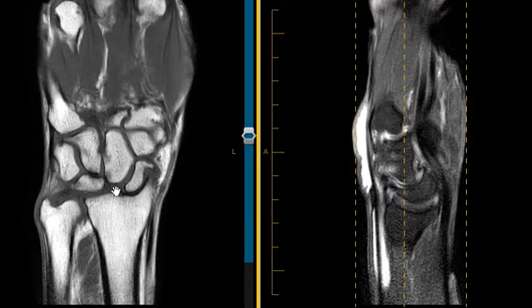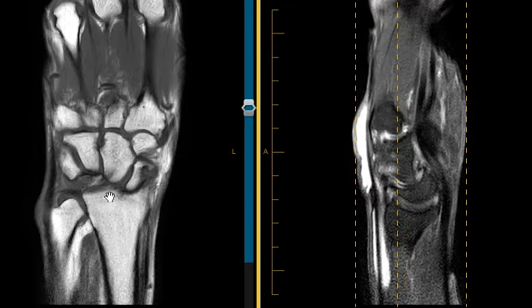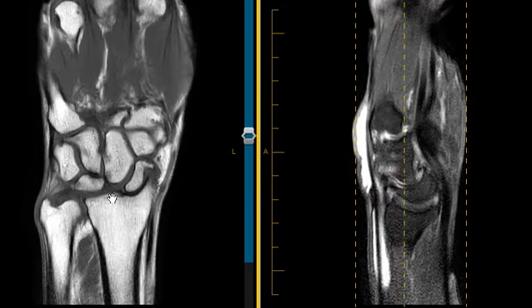And when that's ruptured, this bone can drift downward. This is called the capitate. And this can drift down, down, down between these two bones and cause them to widen and separate, like it has happened here. And this capitate bone is actually touching the radius. Normally it's held far away from the radius by this bone. So this is an abnormal configuration related to rupture of this ligament, the scapholunate ligament. The capitate bone is migrating proximally, causing widening here.